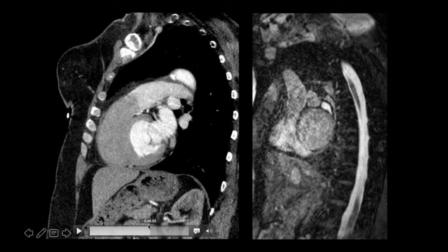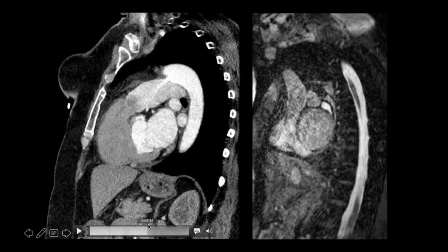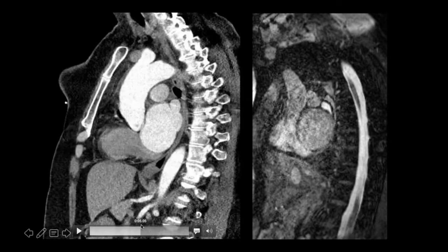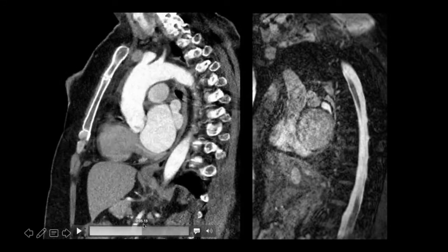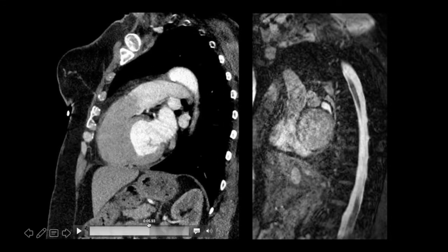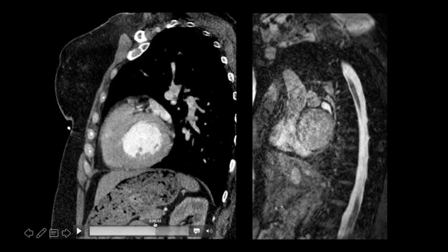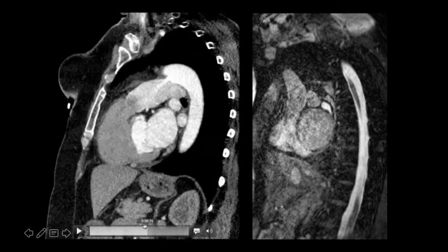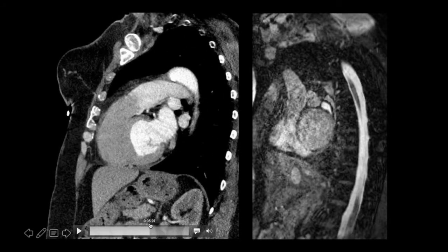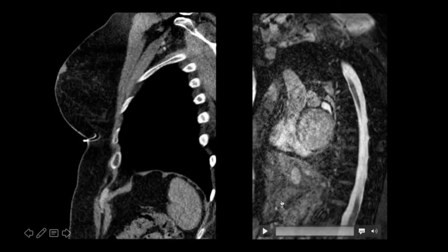So we did mention the PDA in 2015 and recommended further imaging, echo, and nothing was done. So this is 4 years later in 2019, and the pulmonary artery is larger, the left atrium is larger, and the left ventricle is larger. And I guess they eventually did not do surgery on the aorta and the aortic valve because the valve wasn't severe enough to do surgery on yet.